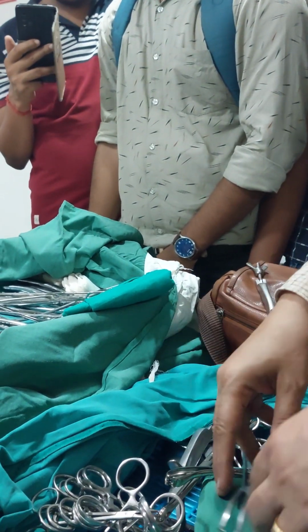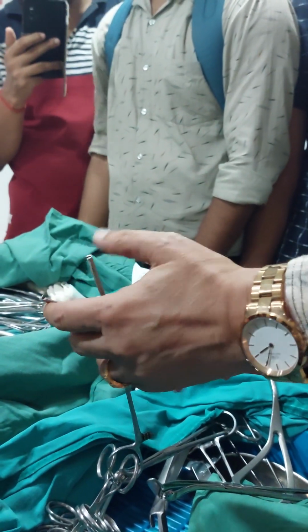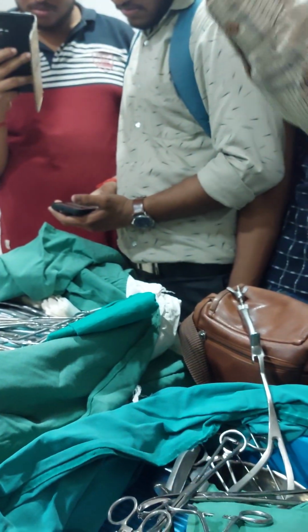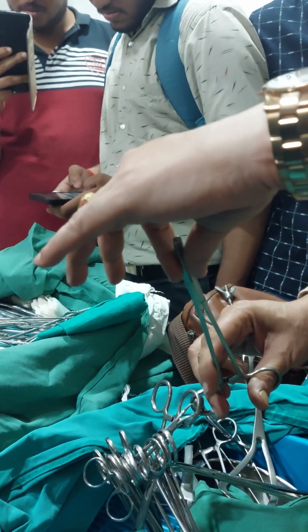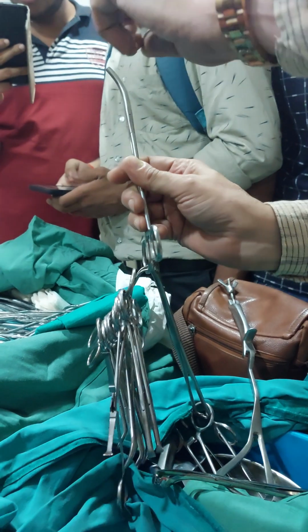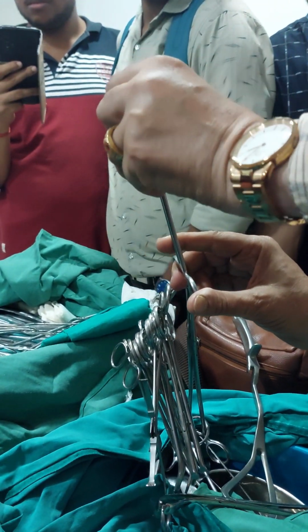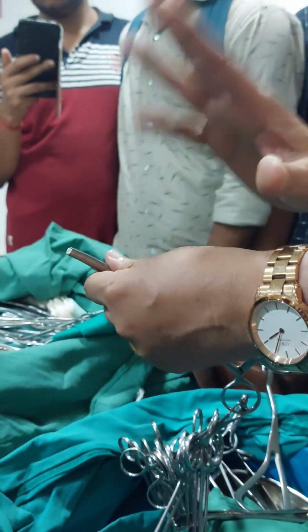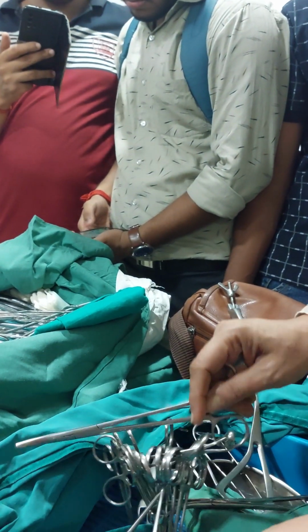So these pedicles are held with this hysterectomy clamp because this will not slip off. The serration here means there will be no slipping. Otherwise, a normal artery forceps will slip off, and then massive bleeding. When I close this clamp there is no space, you can see it is absolutely closed, so the whole tissue will get totally snugly covered in this clamp, and then you can cut it safely. There will be no bleeding, no slipping, then you can suture it.